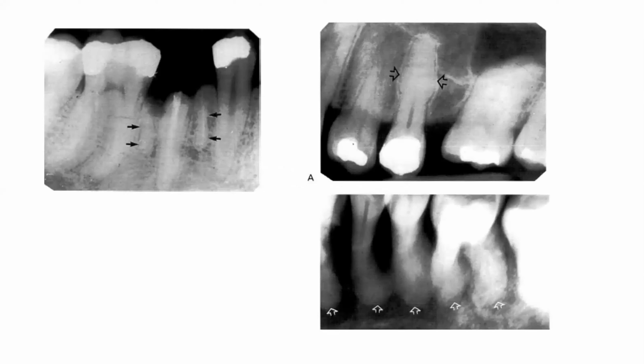Next, on the left is a radiograph of root remnants. So basically, deciduous and permanent root remnants remaining in the alveolar bone following attempted extractions are common. The site, shape, and density make radiographic identification relatively simple. Additional diagnostic features include the surrounding radiolucent line of the periodontal ligament shadow, and sometimes evidence of root canal treatment, as we can see on the radiograph on the left.